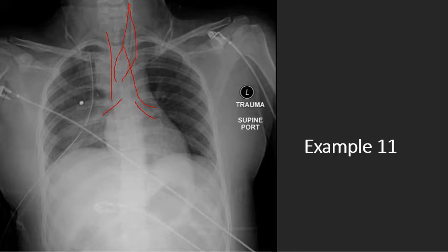Well, I don't have a good answer for that, but the endotracheal tube is in place appropriately. You have your bones, don't appreciate any cracks anywhere. And then you go to cardiac, less than 2/3. Here's your cardiac silhouette. Diaphragm, no air in the diaphragm. The costophrenic angles are a little blunted, maybe a little bit.